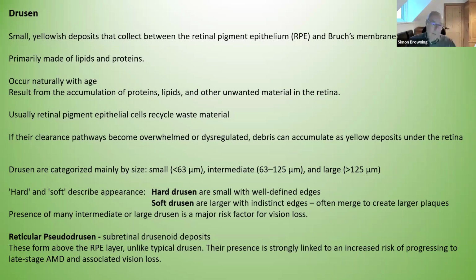And don't forget also, if you're seeing plaqued drusen in the extreme periphery of the retina there, this has been shown to correlate very, very much with amyloid plaquing within the brain. And this association with Alzheimer's and dementia is very, very well established now. So I'm not going to go into the medico-legal route of diagnosing early, previously undiagnosed dementia and Alzheimer's.